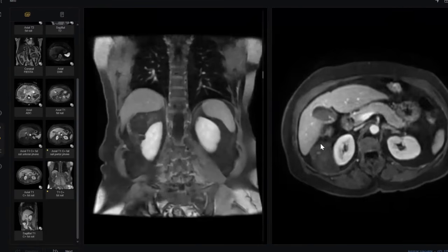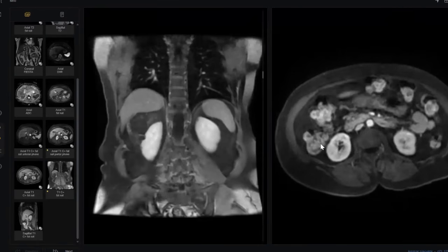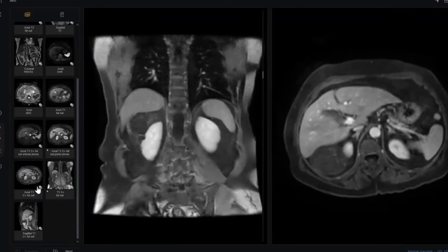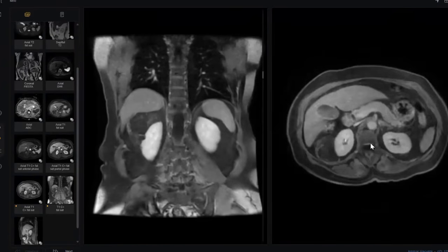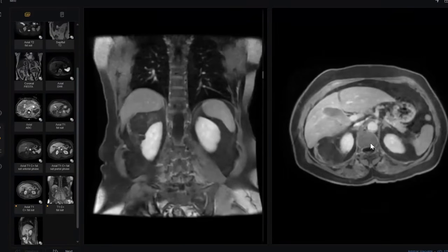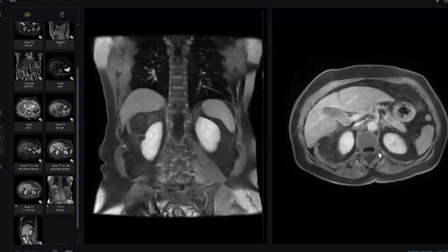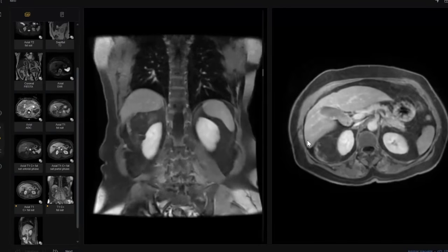Doctor, there is a large soft tissue enhancing component, not a small one, in a retroperitoneal perinephric large fatty lesion. See how it hides the kidney. I do not believe that this is angiomyolipoma. You are the radiologist and you must persuade the clinician. What should you tell him, or what will you tell him?